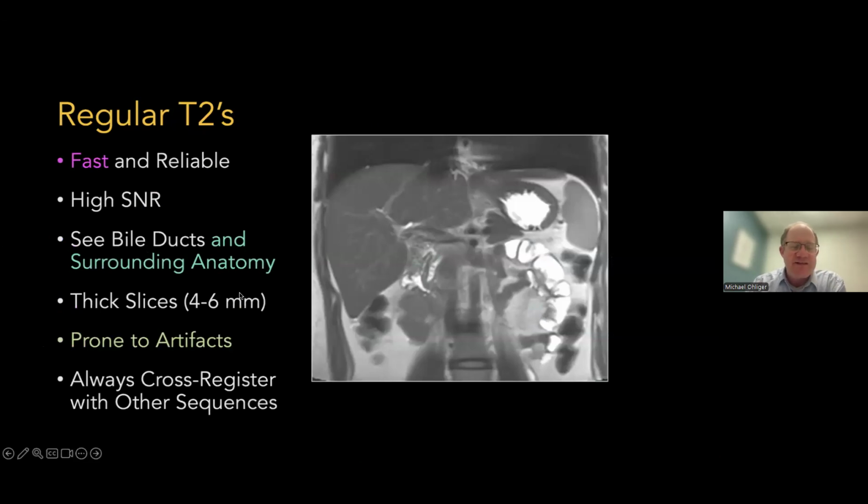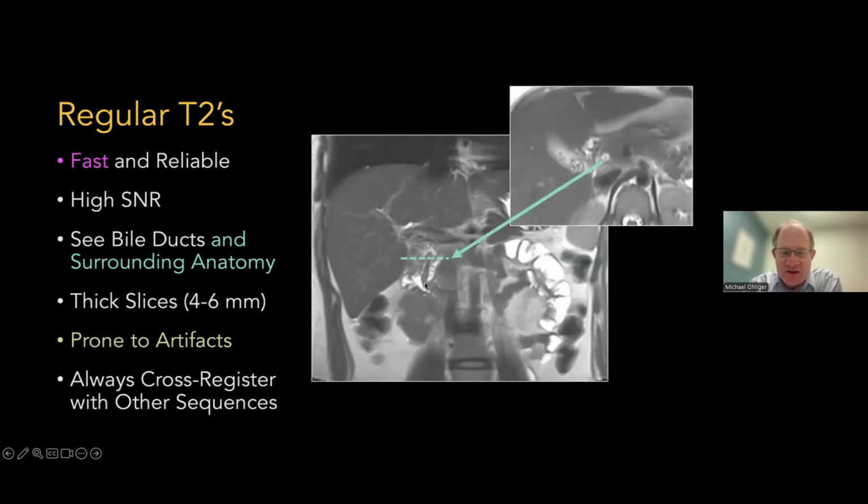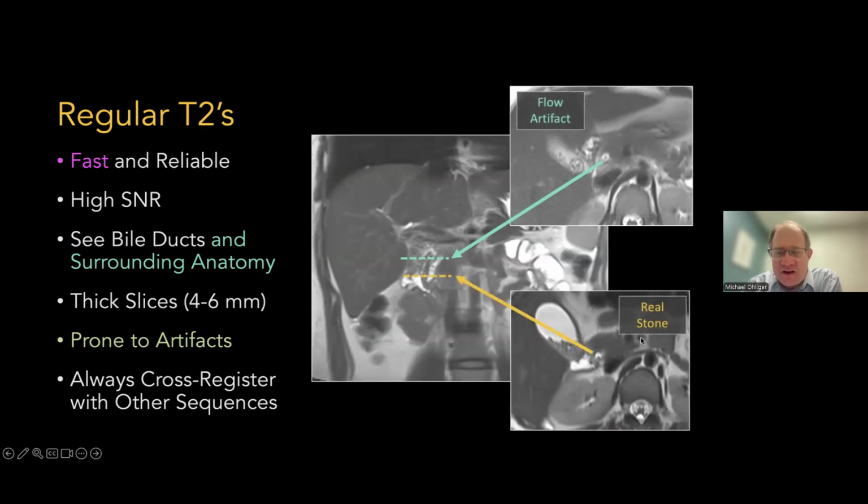And so the first thing is just what I call a regular T2. So again, if you're looking through, and I encourage you to look through the scans of your patients, this is the same scan I was talking about that's part of a regular MRI. This isn't even really an MRCP, but you actually see the ducts really well in this scan. You can see the common bile duct here, which is right there. And you can see those little 3 circles down there, which are stones, right? They're like little layering stones. And here are all the little cute gallstones in the gallbladder. So we can see the stones, and again, we didn't even order an MRCP, so you wouldn't need an MRCP for this. This is just regular T2 weighted imaging.